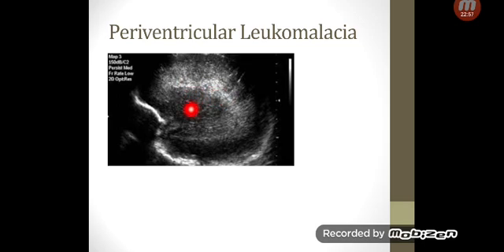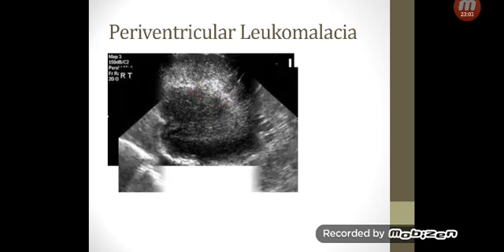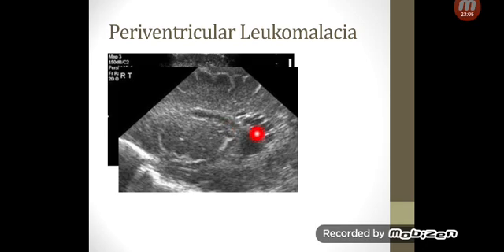So if we go back to a choroid plexus, you would appreciate that it's really bright. If that persists for 7 days, that's grade 1. Now you can see some cysts where the usual flare is. These cysts are only here on the parietal lobe. They're not extending to the occipital, not extending to the frontal. So this is grade 2.